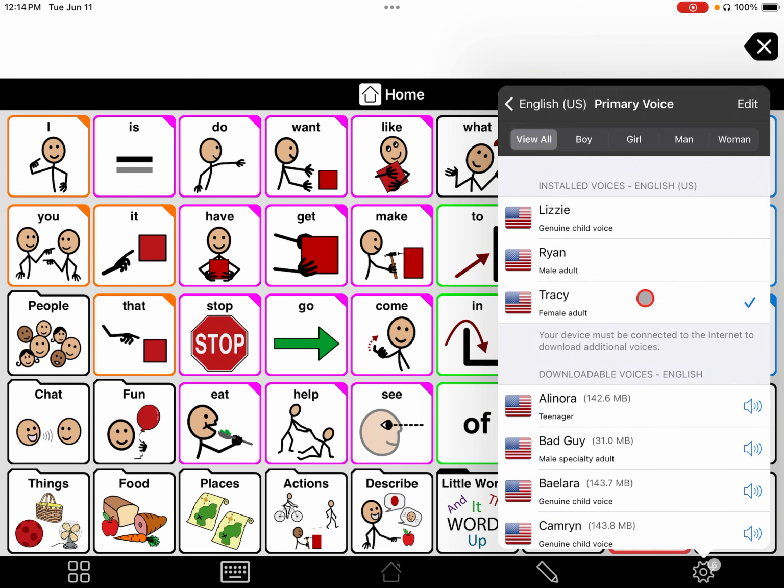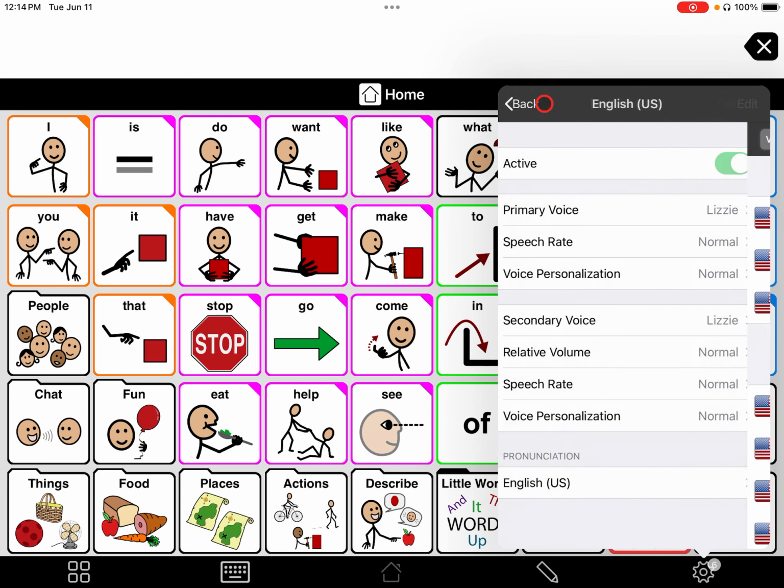Hi, I'm Tracy, the female American English speech synthesis. Hello, my name is Lizzie.